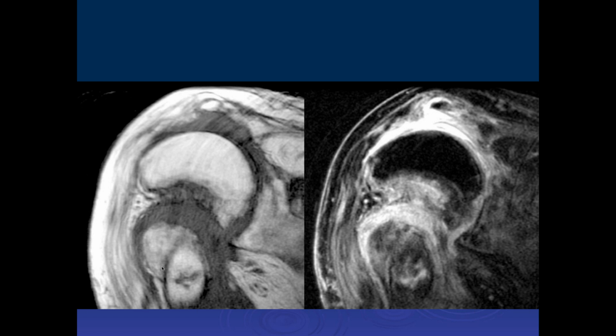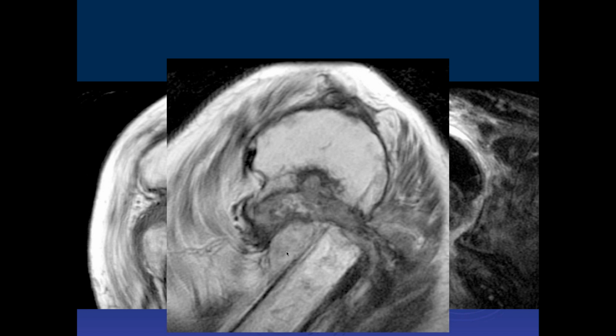Gosh, I can't tell if that's an additional fracture or if this is hemorrhage and granulation tissue. I wonder what the age is of this. Yeah, this is pretty old, I would think, don't you, John? There is some corticated margins here and hyperostosis.